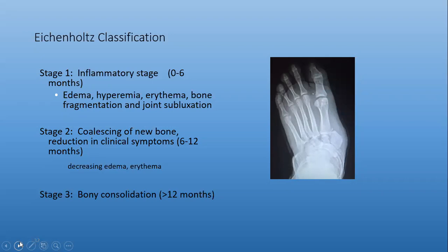And that dislocation, that lateral dislocation, sorry, that's the medial cuneiform. Yeah, sorry. Lateral dislocation. So is that homolateral, ipsilateral, divergent? How would you describe it? Because if this is essentially a Lisfranc injury in the form of Charcot, what kind of description do you give that? I would say homolateral.